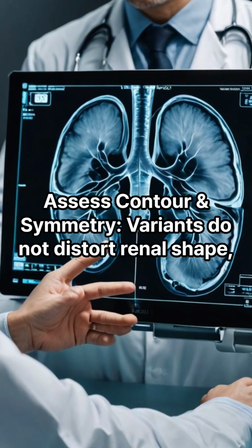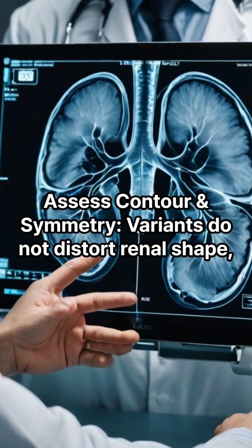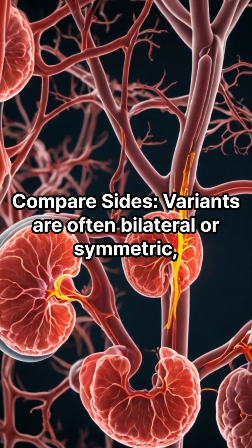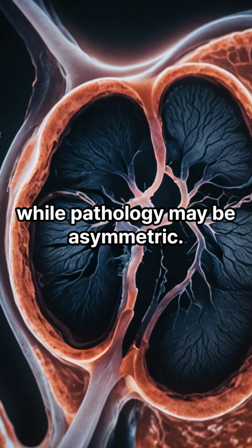Assess contour and symmetry. Variants do not distort renal shape, whereas masses might. Compare sides. Variants are often bilateral or symmetric, while pathology may be asymmetric.